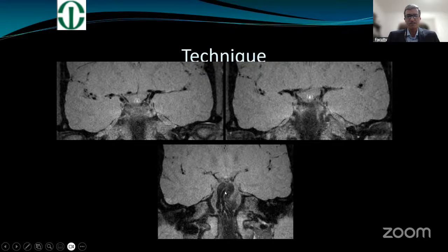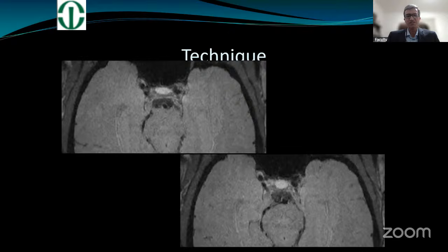And you can see the basilar artery here, and you can also visualize the anterior inferior cerebellar artery here, right? And these are the vertebral arteries. So these are the axial reformats showing you the axial images without loss of resolution and nice crisp images of the vessels.